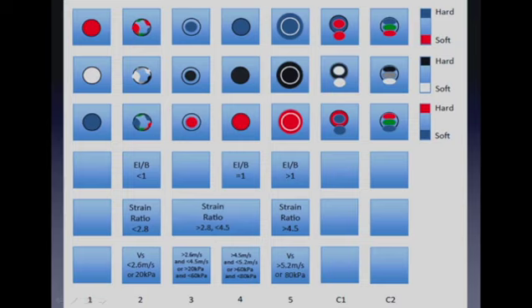If we look at shear wave imaging, again, there are different methods of looking at this information. But if we look at all of the papers, let's use kilopascals here, and I give you the meters per second here also. Every paper that had a lesion of less than 20 kilopascals has shown that those were benign lesions, so we're going to give that a 2. And all the papers that showed greater than 80 kilopascals have shown those to be cancers, so we'll give that a 5. In our hands, we use 60 kilopascals, and other people have come up with 60 kilopascals as their cutoff number also for malignancy, so I gave that a 4.